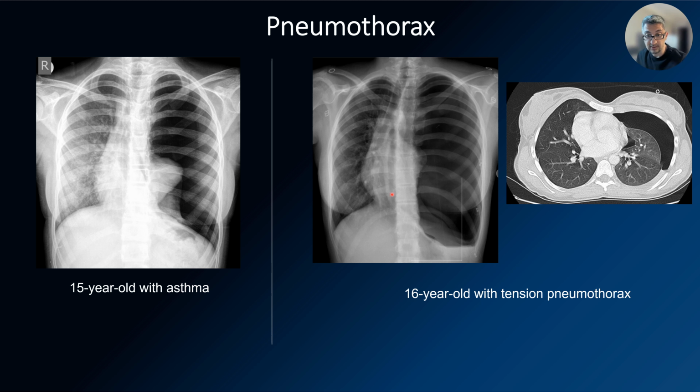When there's mass effect, as you can see here, significant displacement of the heart and mediastinum along with trachea, this patient needed immediate intervention.